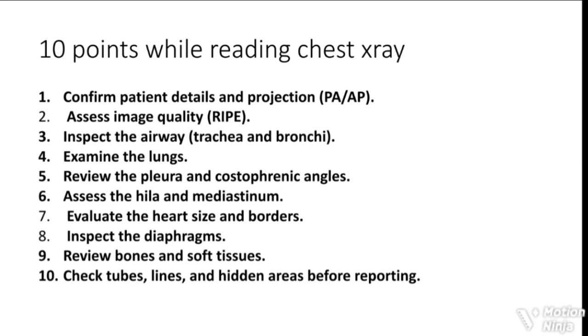You can also check for tubes, lines, and hidden areas before reporting. So that is how you read a chest X-ray.